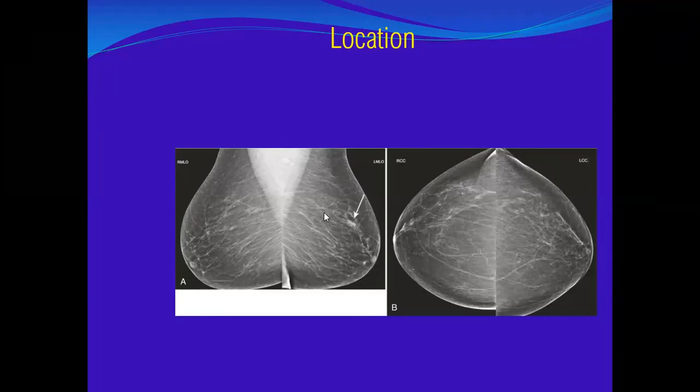Can you defend yourself? First of all, the breast is fatty. So there is not a lot of fibroglandular parenchyma to obscure it. This is one issue. The other issue, the lesion is far from the chest wall.